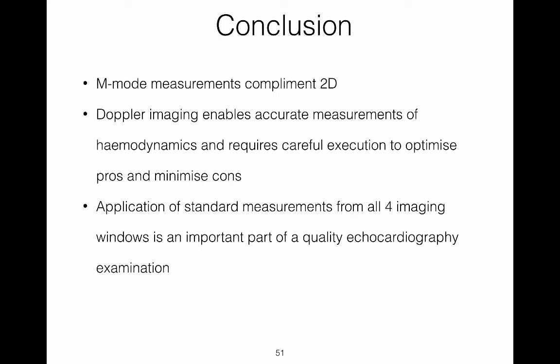M-mode measurements complement 2D images and measurements. Doppler imaging enables accurate measurements of hemodynamics and requires careful optimization. The application of standard measurements from all 4 imaging windows is an important part of a quality echocardiography examination. This lecture has included a number of standard echocardiographic measurements.